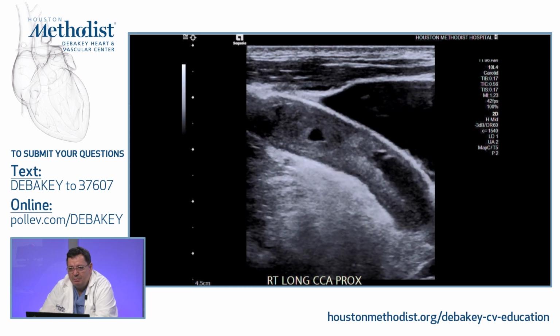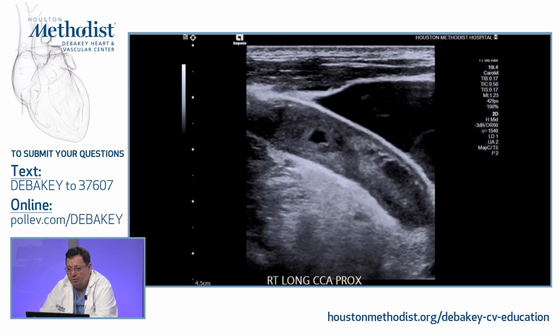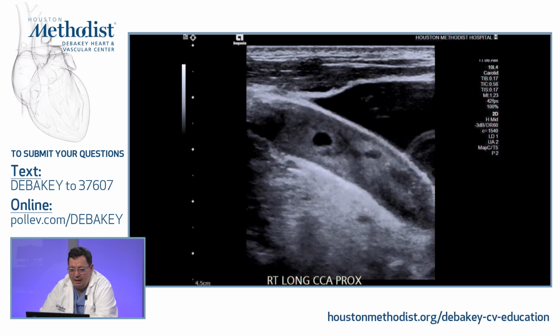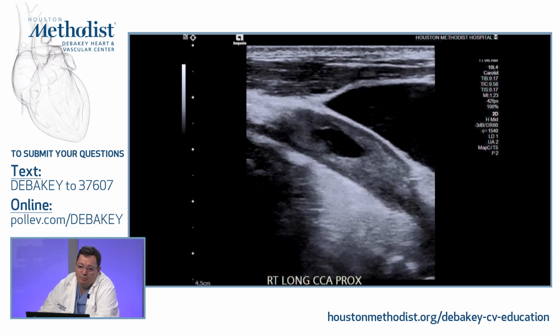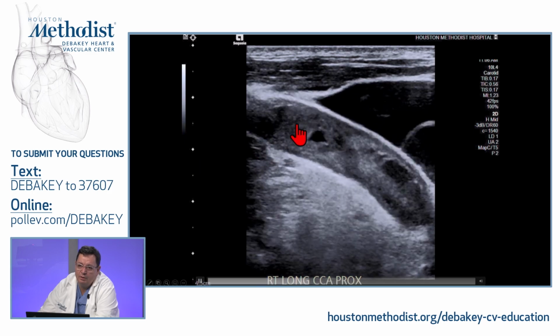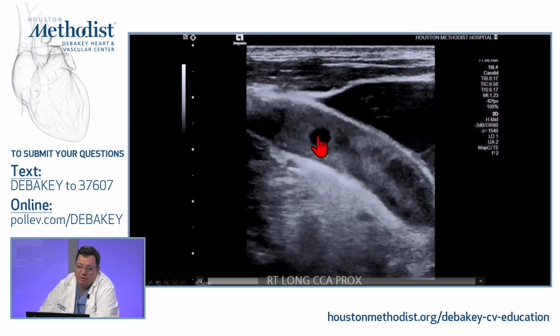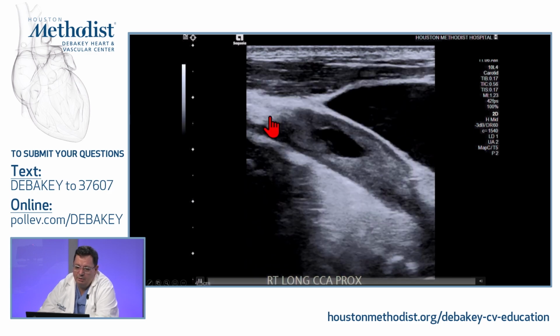video and the presentation make it extremely bright, but when I saw it on my ultrasound screen, it almost sold me as an acute occlusion, because there were some areas which were extremely dark, so this area for example, and I thought that this is not just a cavitation but kind of an option for recanalization maybe with the fresh.